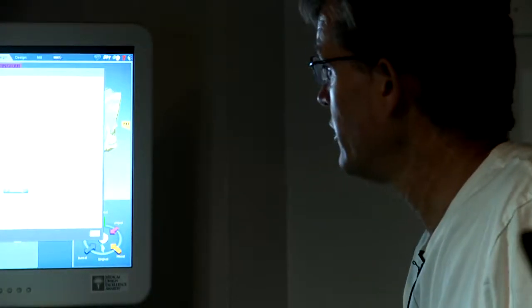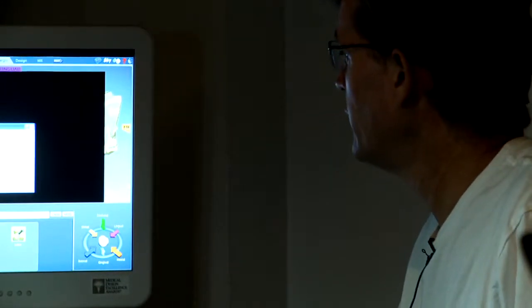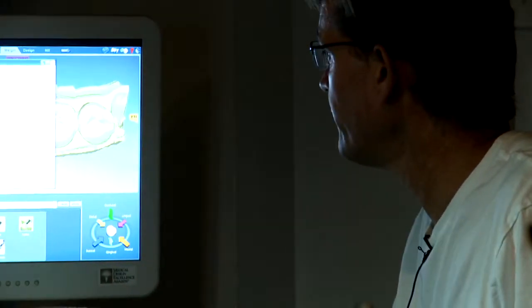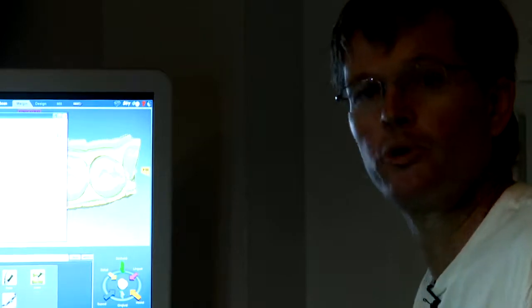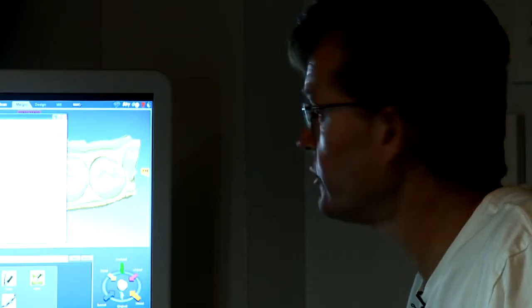It'll now tell me, once it's checked my account details, where I actually want to store that export file. And all I do is go into my desktop here, and I'm going to say, export my file to there. Click OK, and there it is. 0.model.stl, that is now the file, and now we can either import that into another system or send that to anywhere we need to go, like Invisalign or maybe an implant company to get them to design your implant, or whatever you need.